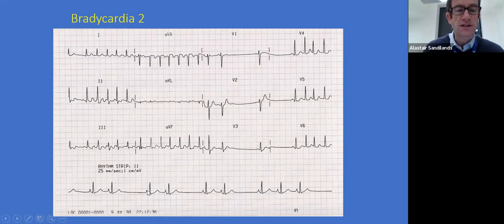Basically, the sinus node, it's an irregular rhythm. Well, it does seem to be slightly regular. Irregularly. And there are P waves firing off going to the QRS. So the PR interval is okay. The AV node is okay. And what else about this ECG tells you the AV node is okay is you've got a tachycardia recorded at this point in time. So don't forget, ECGs will be recorded these three first, then those three, then those three, and those three. So there's a different time point. Then the rhythm strip comes last.